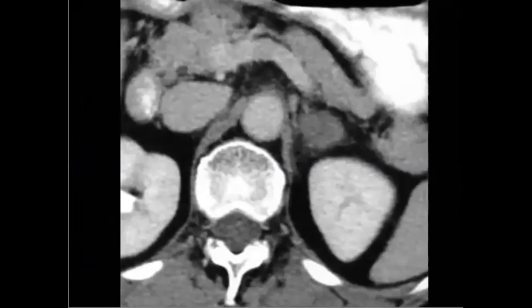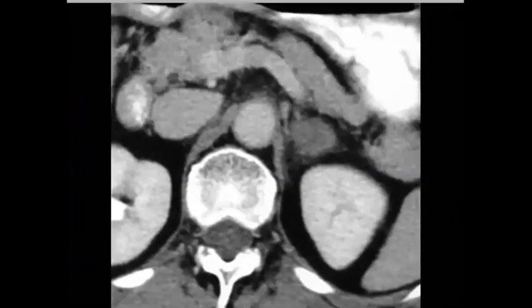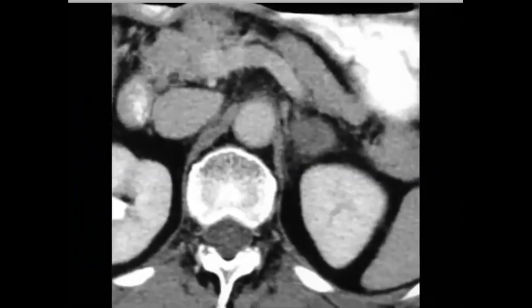This is also one of the MCQ and short questions. Yes. What do you see? Yes, adrenal lesion. Perfect. So for an adrenal lesion, you need to characterize it. Yeah. So what differential would you like to mention? Perfect. So adenoma will be one of the best differentials.